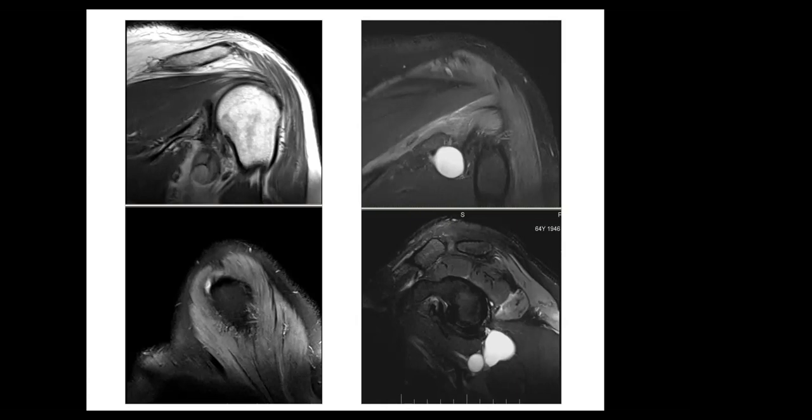On sagittal imaging, the labrum is not clear, the section does not appear completely in the section, so we can't judge if there is a labrum injury. And also there is abnormal high signal intensity in the supraspinatus tendon at its insertion site.